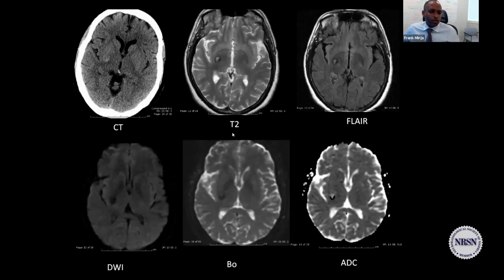So we go ahead and we do MRI, and again, you see that hemosiderin rim with a bright central signal here on a T2 and also on a FLAIR. And again, on the susceptibility weighted, one we have on a diffusion and on the B0 just to show they have corresponding susceptibility artifacts. Again, cavernomas, once you sort of suspect it, they're very easy to basically confirm whether or not you're dealing with a cavernoma.